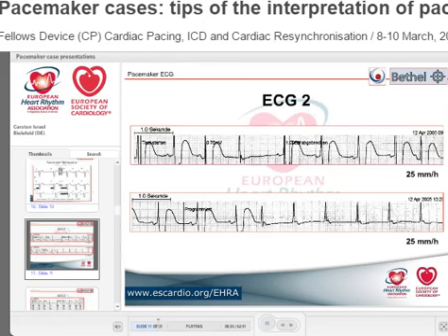And I made a programmed atrial pacing test: atrial pace, P wave, atrial pace, P wave. Maybe some of you will notice something is missing. If you do daily pacemaker controls, it would be nice if you see that there's something missing and you stop what you're doing, because this is harmful. What could be the reason? This is something I hope you will never see, but it can happen at least during testing, and it can happen in some older devices.